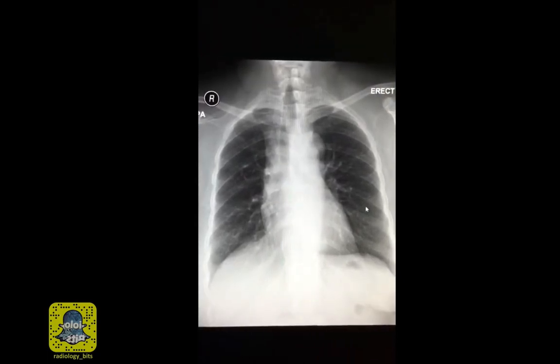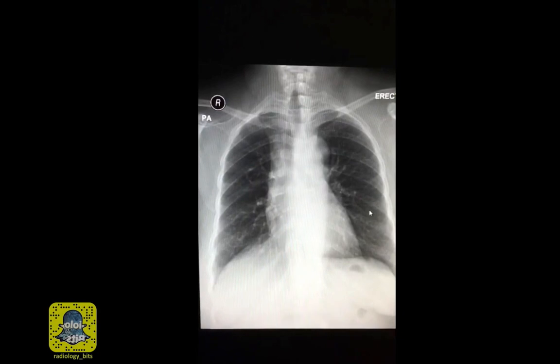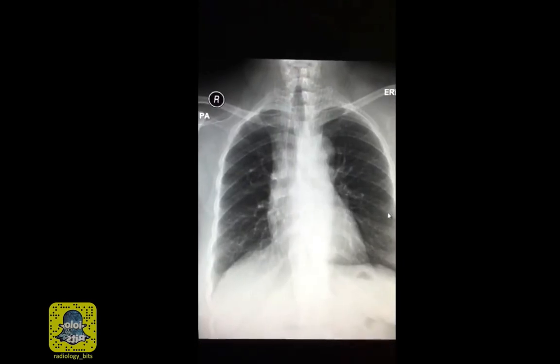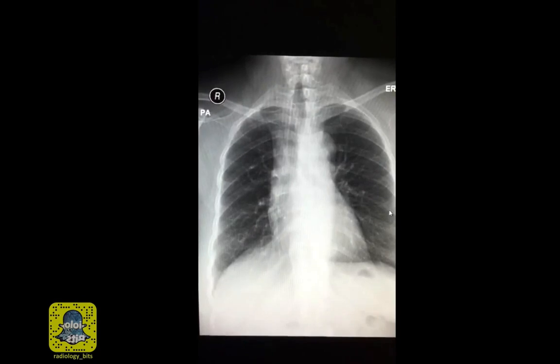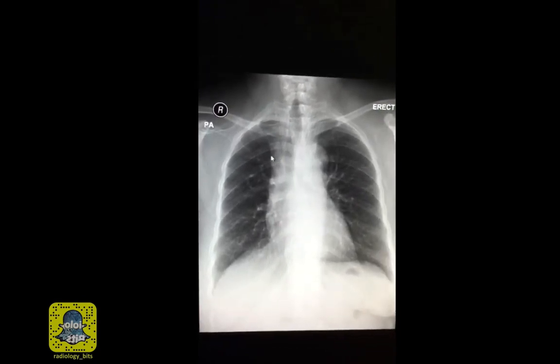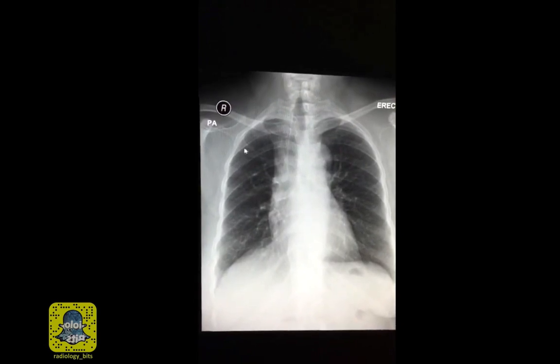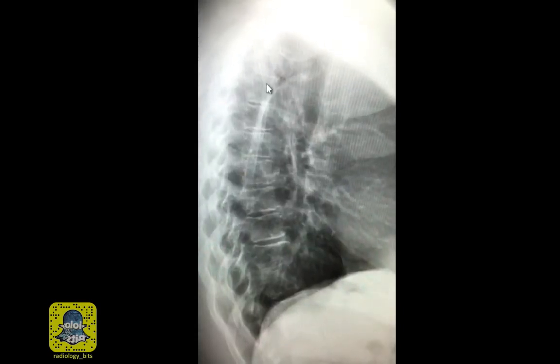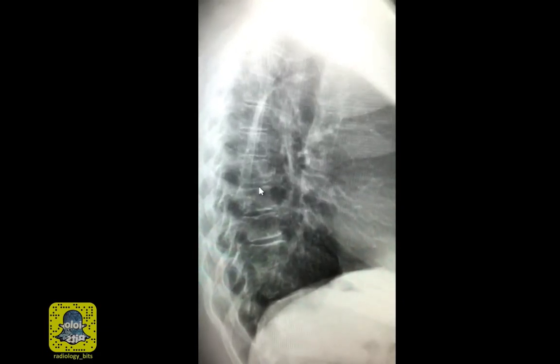Although when we read chest radiographs, we claim that we're looking at bones, sometimes we don't look at them carefully enough. We have to look at every single bone very carefully. Our index of suspicion when we look at bones should be very high if we're provided with pertinent clinical information such as a primary malignancy. We all look carefully at ribs, but don't forget that the clavicle and scapula are considered hidden areas. And remember another hidden area, which is the spine, that could be better seen on a lateral chest radiograph.